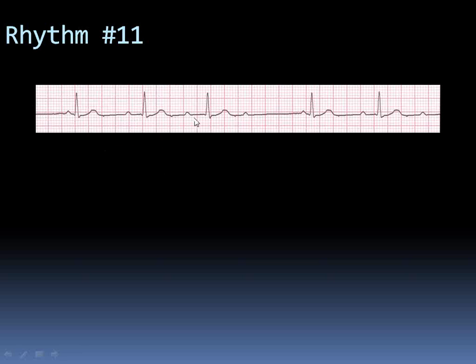This is the third, which lengthens even more. And then this is the fourth one, and there is no QRS after this, right? So every fourth beat is non-conducted, and over here the third beat is non-conducted. The patient has increasingly longer PR intervals, and then you have a P wave without a QRS. Okay, so this is a typical ECG of a type 1 second degree AV block. PR prolongs and a dropped QRS. PR prolongs and a dropped QRS.